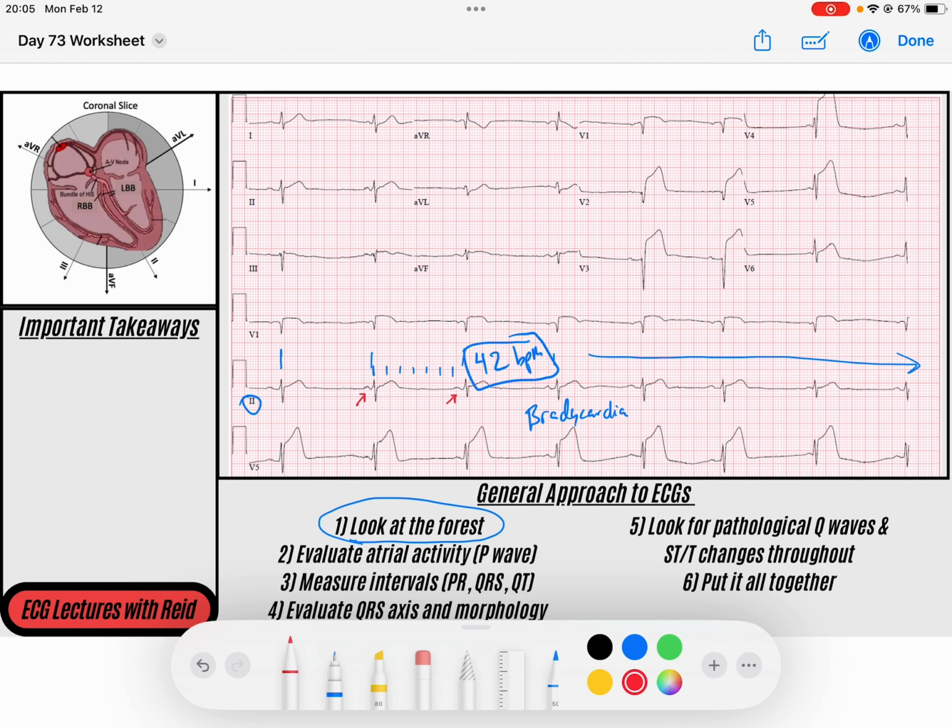And so the next thing I'll do is head straight into my atrial activity. We go down the conduction pathway, and the first thing it's going to depolarize is the atria. And so I look and I see I've got some P waves. My P waves appear to be upright in lead 1, and they appear to be upright in aVF. So that tells me that they're heading down and to the left, which is what we usually see in atrial depolarization. And so that is a sinus P wave. And so I'm starting to work through, is this bradycardia just a sinus bradycardia? Is there any AV block? And that's what we're going to head into next: what is our PR interval?